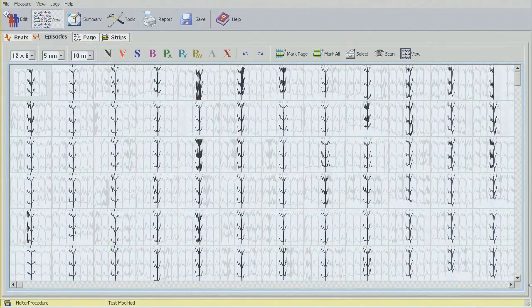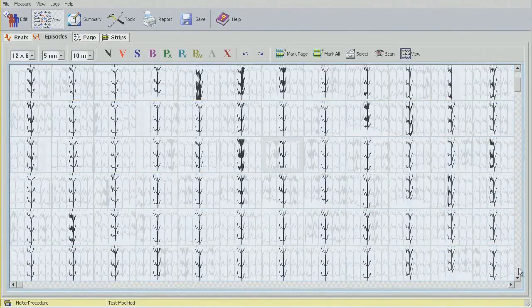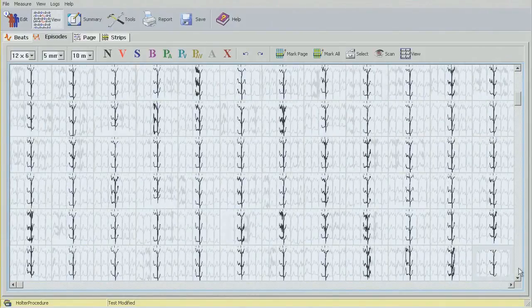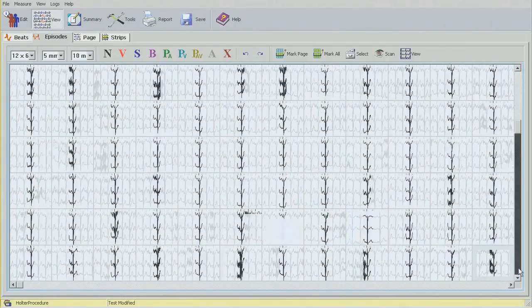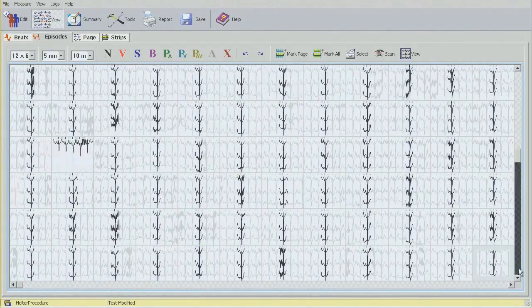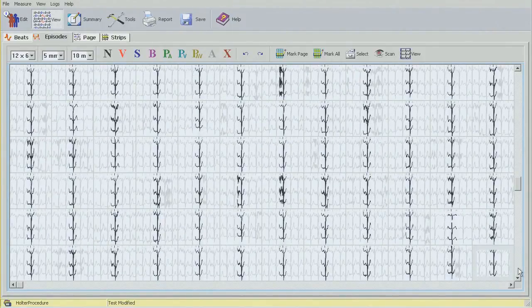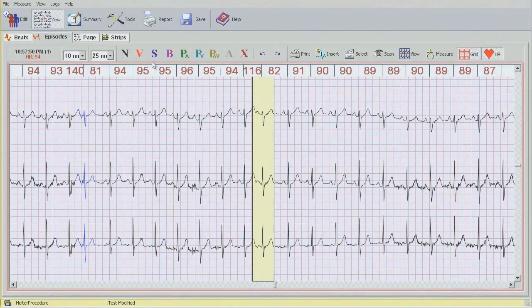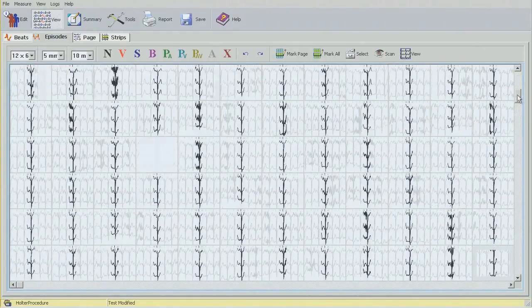I'm just going to scroll down to check the rest of those. Another early beat. And I think I also have it down.